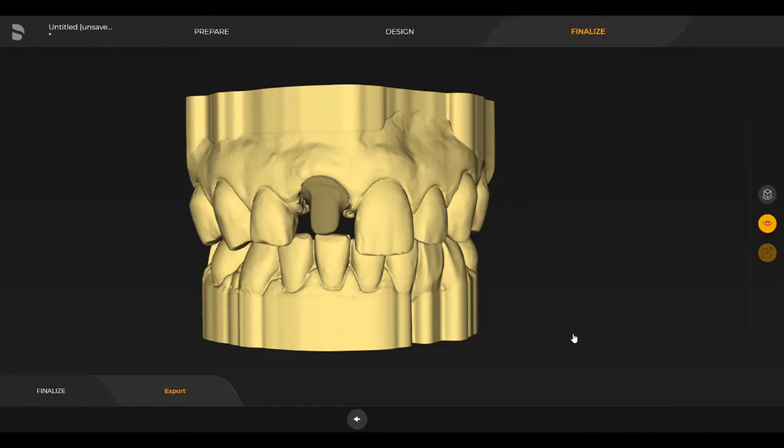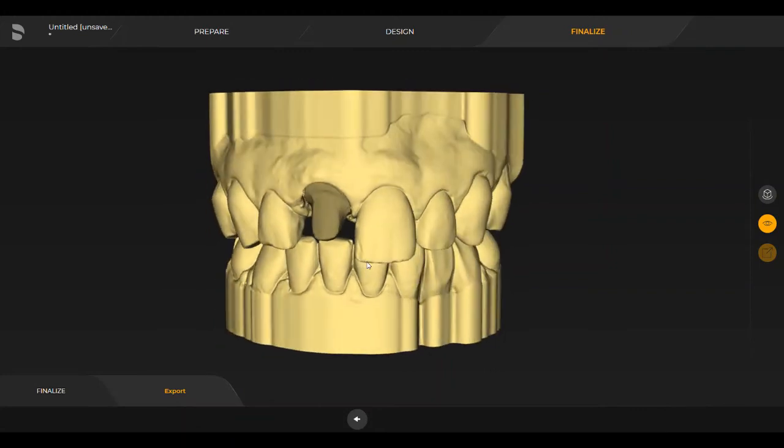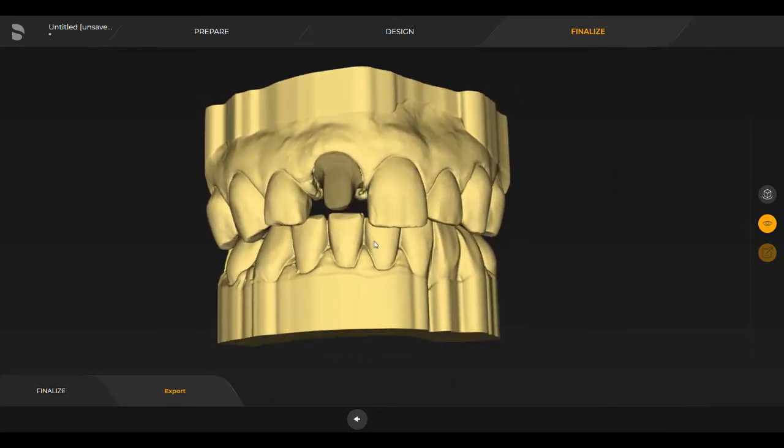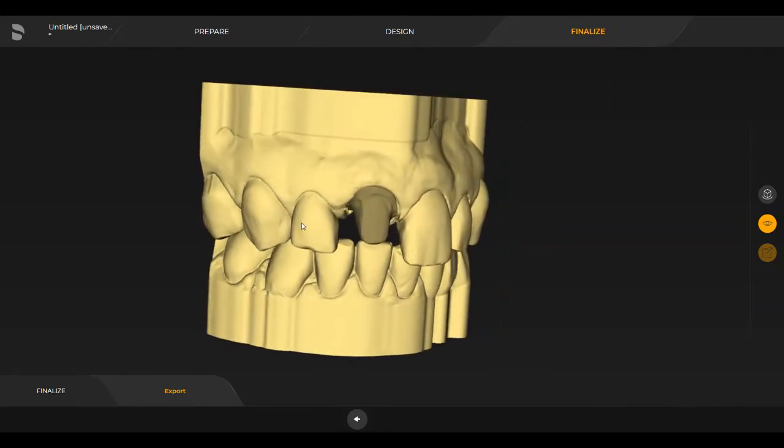The next thing you want to do is export each file individually. So you're going to select an upper and a lower, and you're going to uncheck this single file box. And when you click Export as STL, we'll put number 8 STL, number 8 model. It's going to automatically save an upper and a lower to the desktop for us. So that is all you need to do to submit to the Army Dental Lab and attach those 3 files to your LabTrack Connect folder.